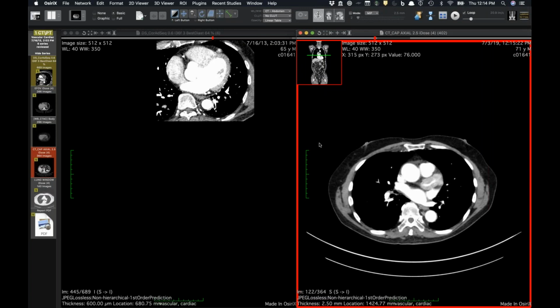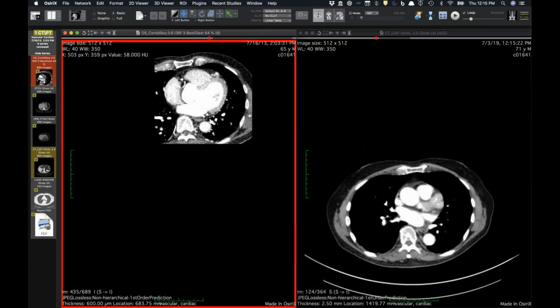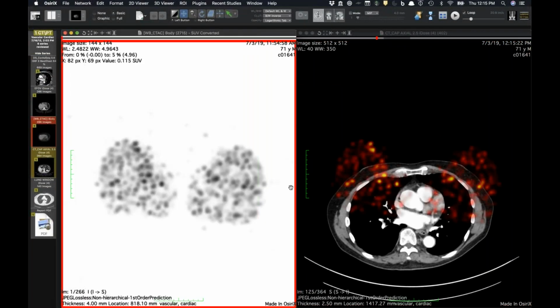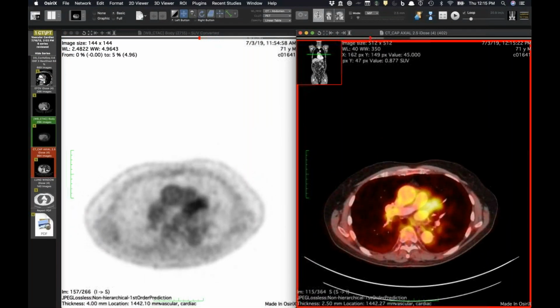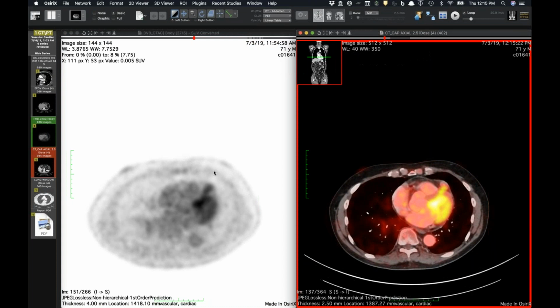And now you can see the stuff has actually increased, that there's more soft tissue than there was even in 2015, or 2013. But I guess, this is all being presumptively treated as IgG4 related systemic disease involving the coronary arteries. You can see that. Well, if I can sync this back up. Picture. I mean, that's pretty freaking impressive.